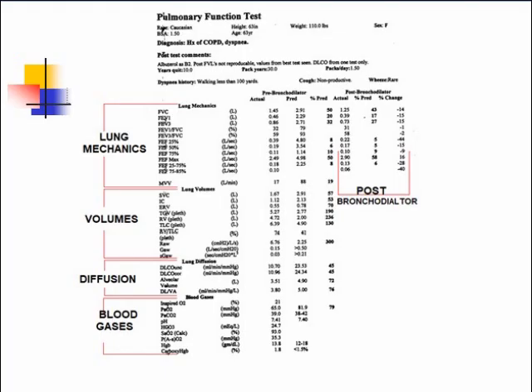Following that is the diffusion capacity, and then we have the FRC, RV, and TLC. Within this whole bit of information, we are really looking at 8 pulmonary function measurements that help us determine what the patient's pulmonary function is telling us. What is the interpretation of that lung test?